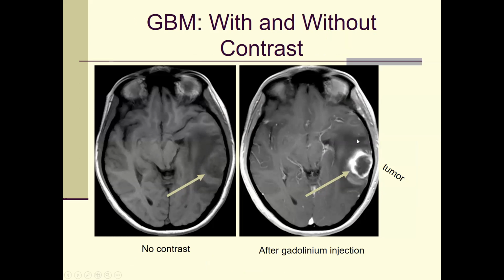And then you can see the surrounding low intensity signal here, and this is the edema, for example. All the structures are a little bit deformed, and those are the changes you can visualize. So the detection of the tumor can be very easily done. And then the surrounding structure assessment: how much of the tissue around it is affected.